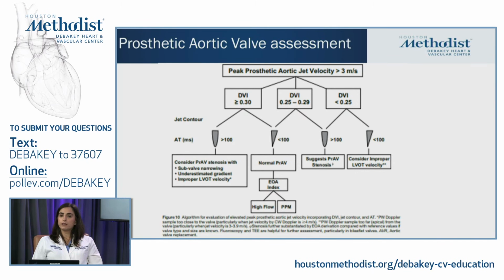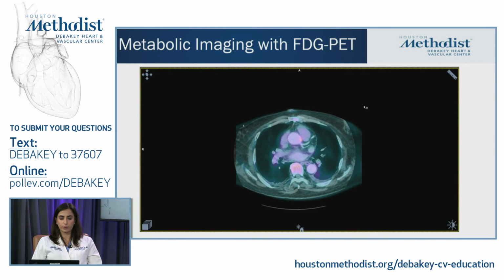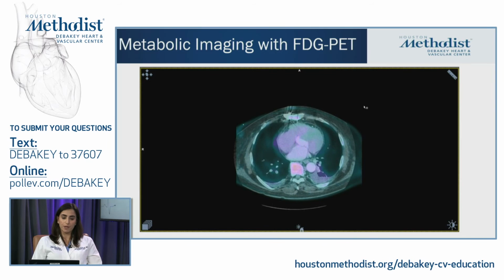So clinically, the patient's not doing well. We needed to get an answer. The patient underwent a CV PET, which is an inflammatory FDG PET. And what we saw here, with a low-dose CT with superimposed PET images on it, through the axial slices, as we go through, the aortic valve is coming in. We're seeing FDG uptake all around the root and significant posterior uptake right there, and an area of anterior uptake by the right coronary takeoff.